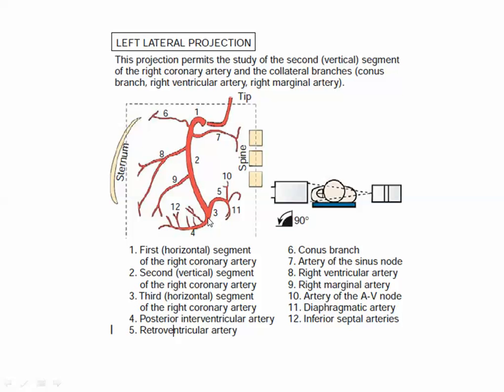So what will this vessel be? This is interventricular, perpendicular to the atrioventricular groove, yes? So this will be the PDA, and you're expecting the LAD to come here to communicate with the PDA. And you're expecting the LCX to come here, yes? So where is the pulmonary?